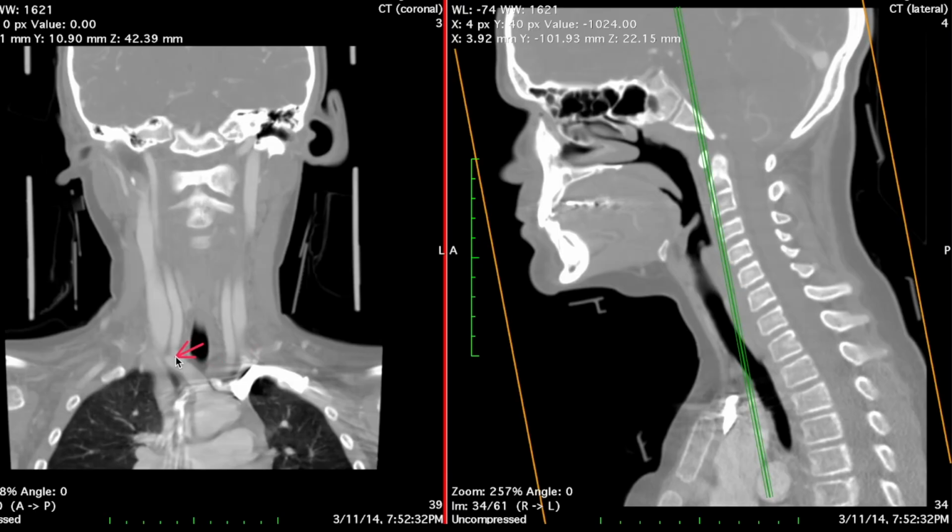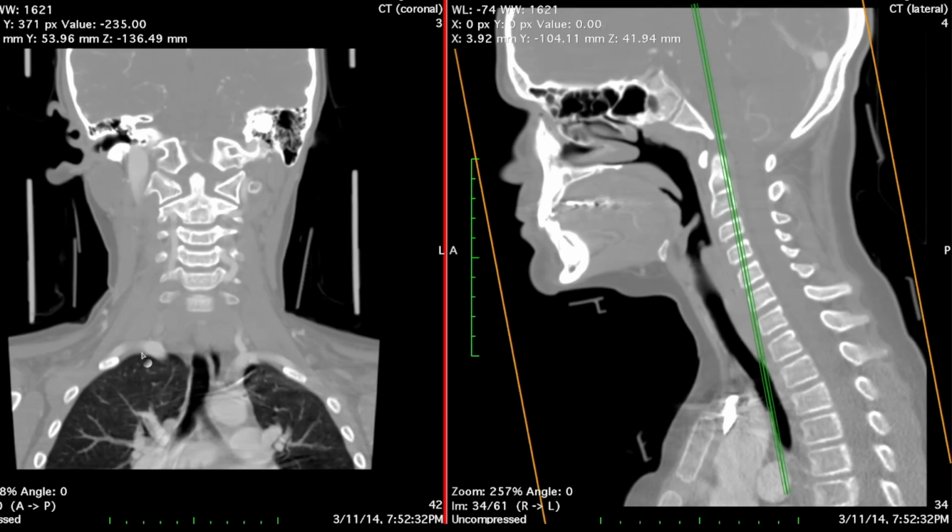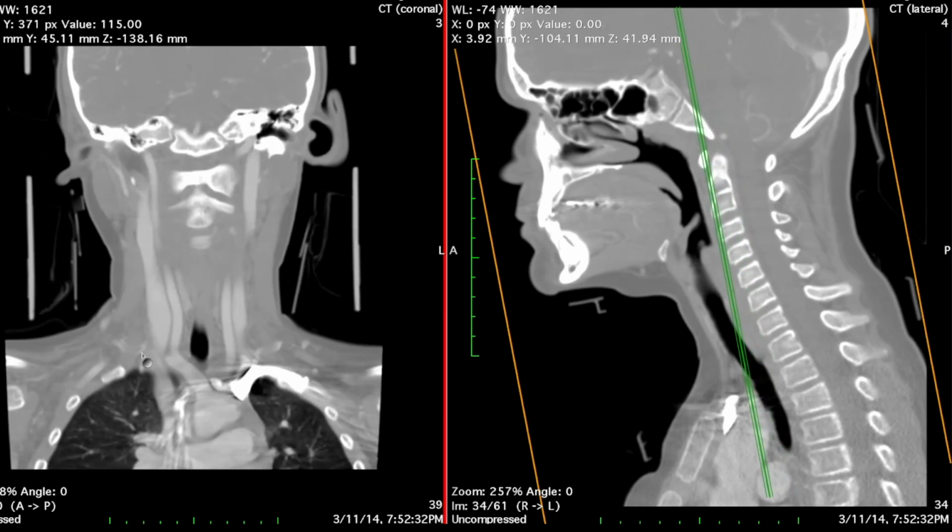At this point in the brachiocephalic artery, we can appreciate that there's a bifurcation. And at this bifurcation, the brachiocephalic artery becomes the right common carotid artery that will travel superiorly to supply the head, neck, and face. And laterally, it will be called the subclavian artery, which will go on to course through the arm. So as I scroll, you can appreciate this, following this is the subclavian artery, laterally. And superiorly is the right common carotid artery.